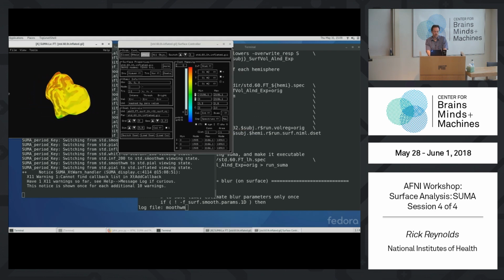Glorious. So what's the colorization here? What are we seeing? What is red versus yellow versus green here? These are just the MRI intensities in the EPI time series datasets for volume index, or now surface index number 0, for the left hemisphere for the volume registered data.